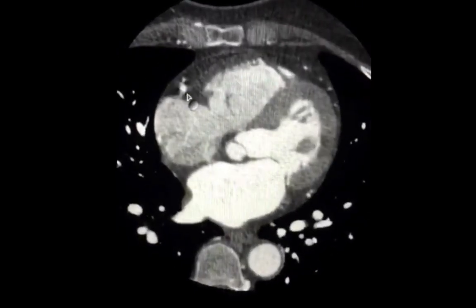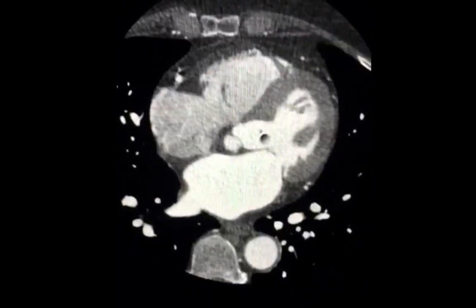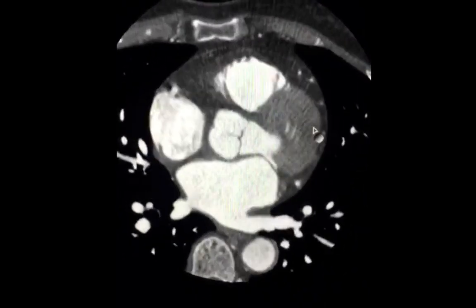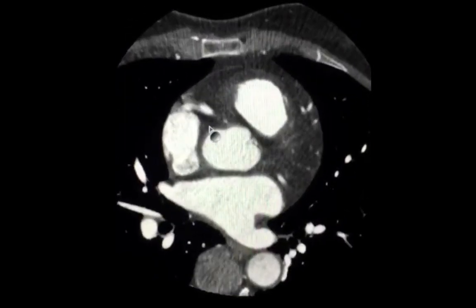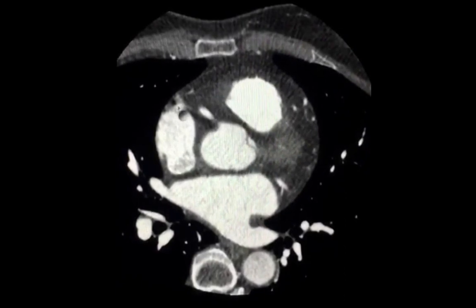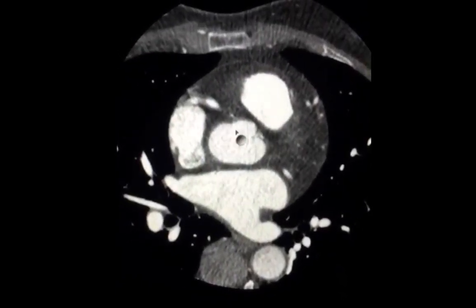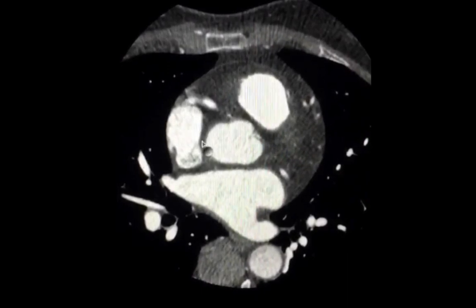Remember that when we're talking about systole and diastole, we're talking about ventricular motion. So when you're talking about diastole, that's ventricular diastole, at the same time where you may have atrial systole. And noticing that the right coronary artery is the closest to the right atrium, at the time of 75% where you have ventricular diastole, you might have atrial systole. So in some cases, the 75% might show you a very nice left-sided coronary arterial system, but the right coronary artery might be degraded by motion.